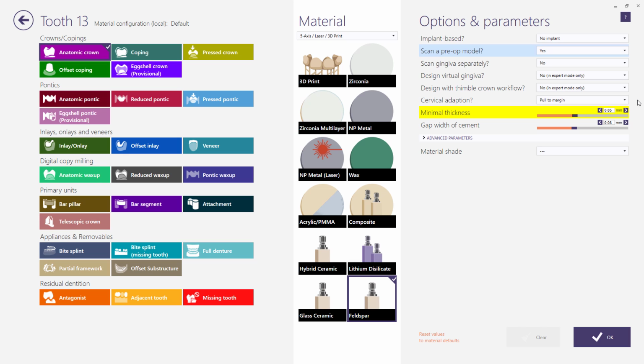Furthermore, numeric parameters can be adjusted. All adjustments to numeric parameters that you make here in the DentalDB module will become the default values for the selected dentist when using this particular material and construction. These adjustments will be saved in the database file and not in the material configuration.